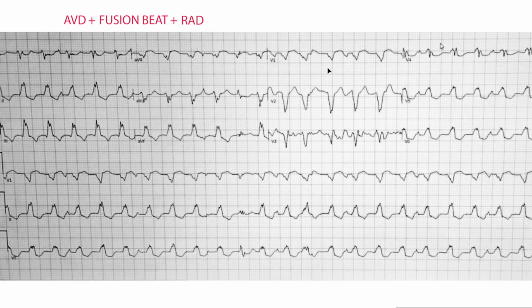So I'm looking at this, and this has left bundle branch morphology. With left bundle branch morphology, I can use Brugada criteria. And when it comes to ventricular tachycardia, this is an extremely, extremely difficult topic. Typically when you go out in the classroom somewhere, or you open up a book, there's going to be a picture of a very aggressive, wide rhythm, and they're going to say monomorphic ventricular tachycardia, QRS is wider than 120 milliseconds, the rate is greater than 100 beats per minute, and they're going to chalk it off and say that's ventricular tachycardia.